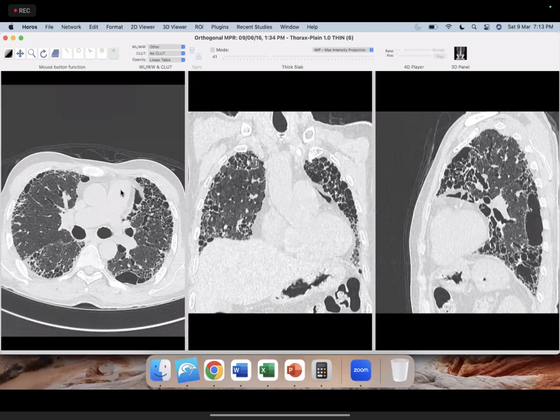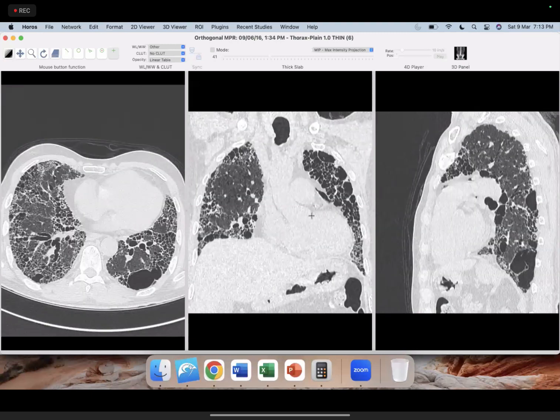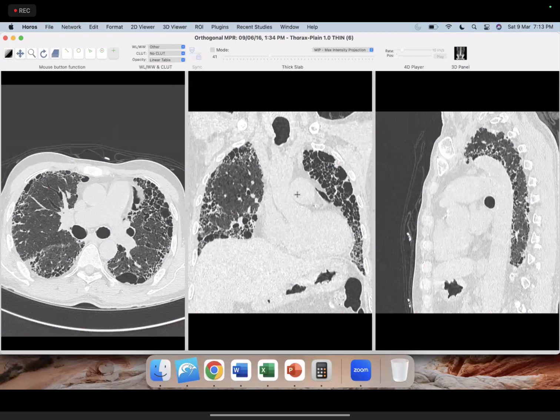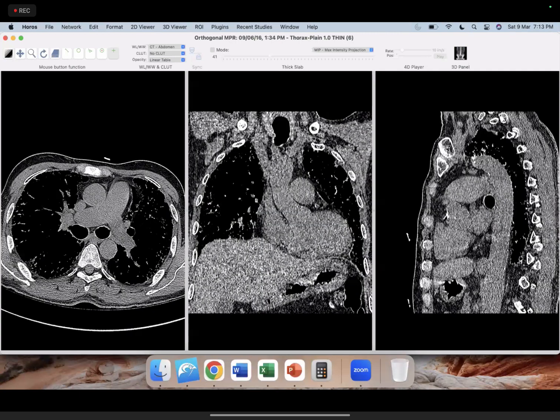Pulmonary hypertension, not really. Even you can appreciate, but we have to measure also. So yes, there is a pneumomediastinum. So again, the whole point is whenever you are looking at the scan, don't forget to actively look for any complication. What you have mentioned is one is pulmonary hypertension, for which we'll simply measure the MPA. If it is more than 29.5, then we will call this pulmonary hypertension.